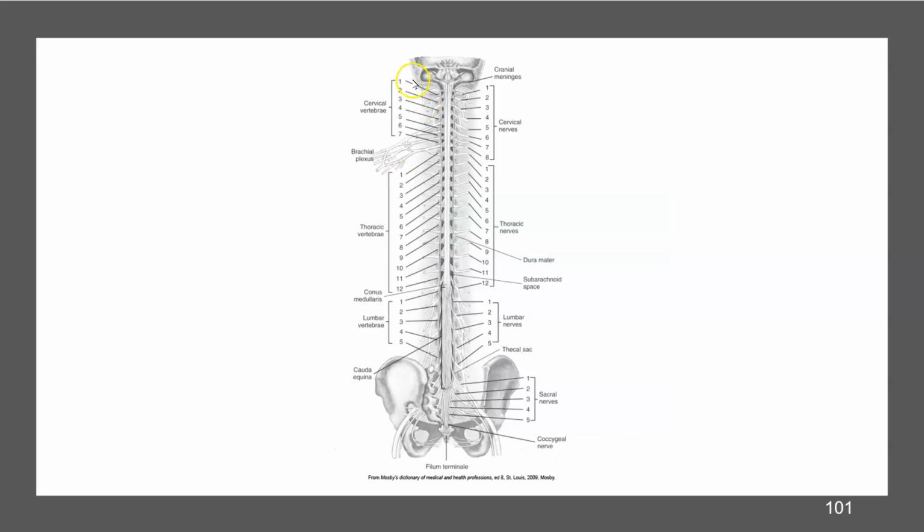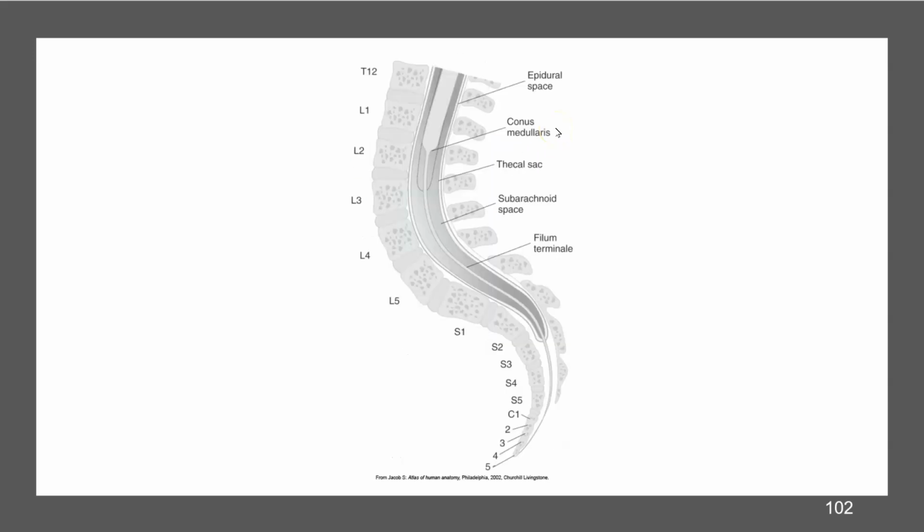All right, so looking here, I wanted to show you the brachial plexus, okay? So we have a sacral plexus also. Important that you see where it comes out. Here is your epidural space, okay? So your spinal cord is right here. So your conus medullaris, you can see where the spinal cord ends, and there's this filum terminale that attaches to your coccyx. So people, when they break their coccyx, it's very, very painful because this is pulling on it, which is holding your spinal cord down.